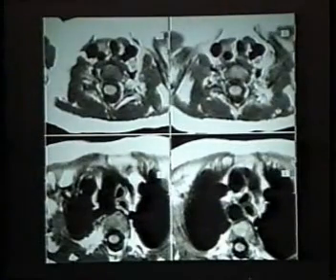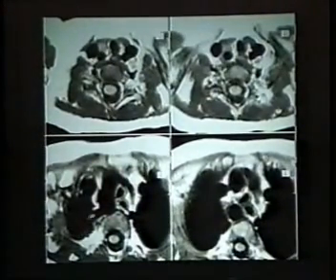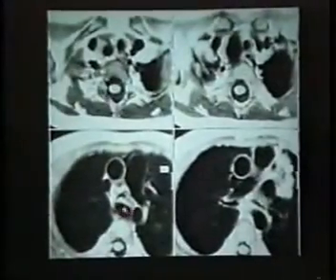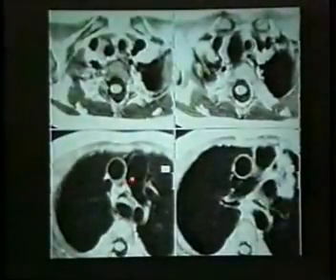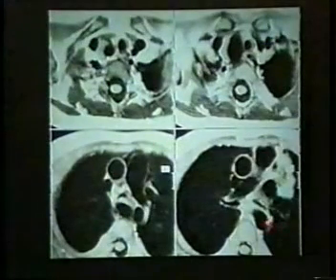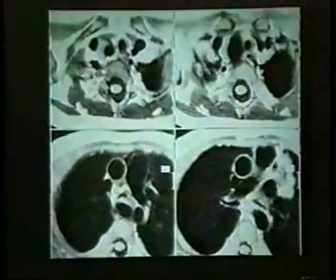This is the axial projection of such a patient. We'll move through this quickly. Your aortic arch, your right subclavian, ascending aorta, descending aorta, as it drops down to descend behind the tracheobronchial tree and give origin here to your left subclavian in this region here. So it swings behind to descend on the left side.